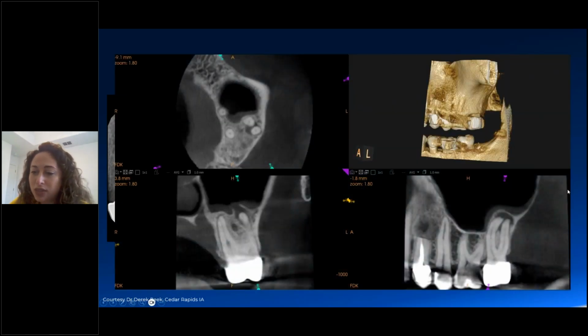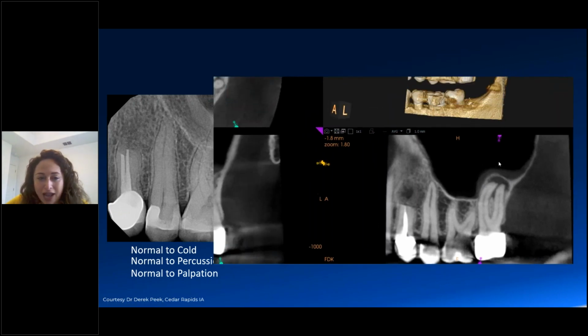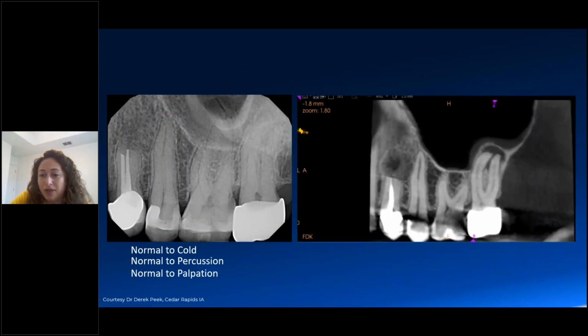But once you see a CBCT scan of this exact patient, you can see that we have a periapical lesion forming around the roots of number 15. And I'm going to go back to this view to see, oh, you also have an interrupted sinus floor with localized mucosal thickening. Now, seeing a periapical lesion forming does not mean that you're going to directly treat that tooth.